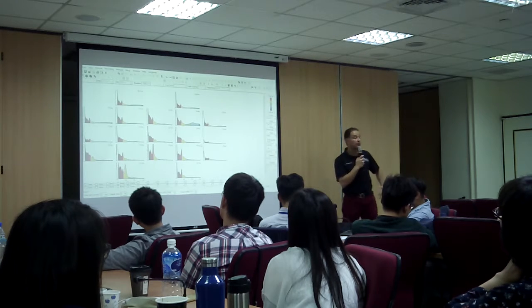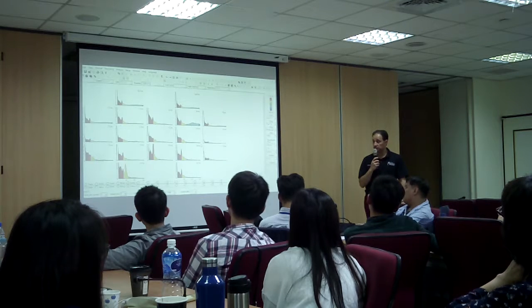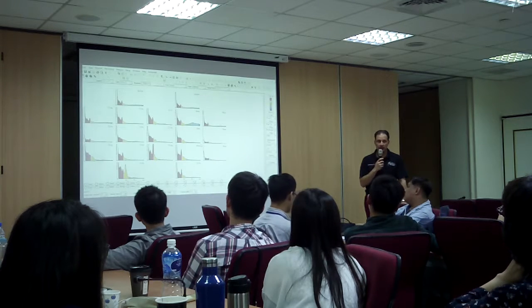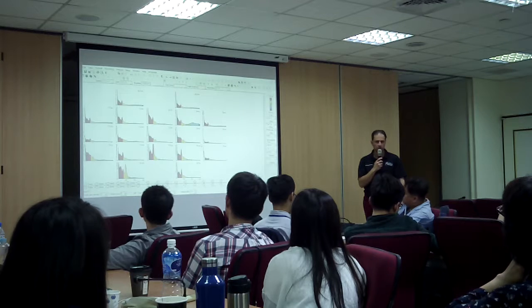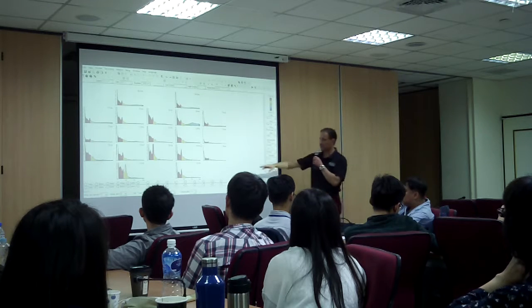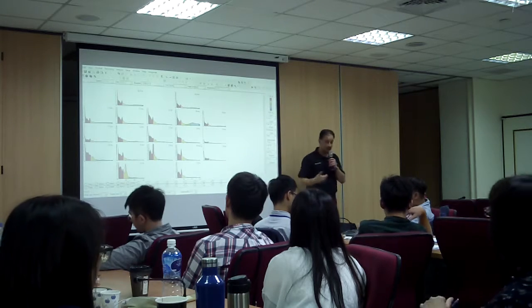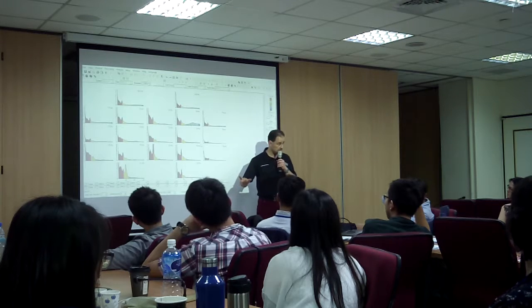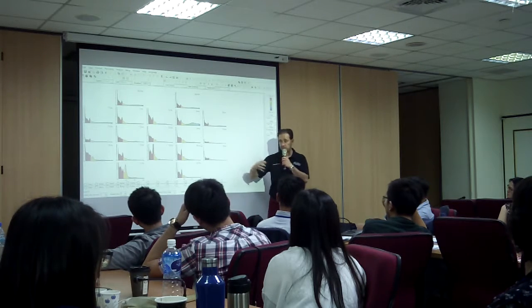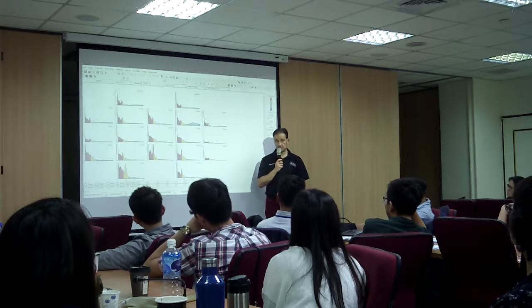Now, when you see a pattern of epileptic discharges such as this one, I would think it would be safe to recommend an MRI, right? Just to rule out any kind of lesion or tumor or something like that, because this could be being caused by a tumor. But since there's maturational and developmental delay, we need to look at the structure side of the brain too. So integrating the work makes more sense.